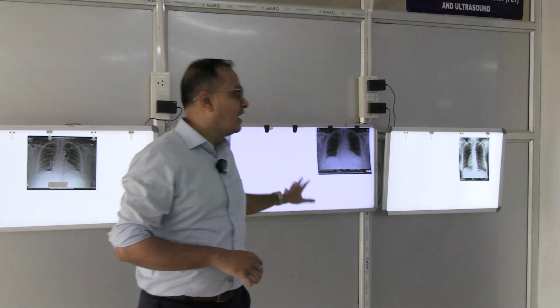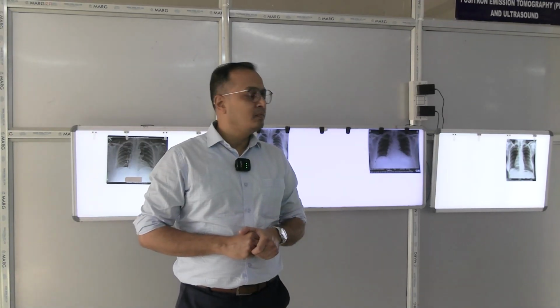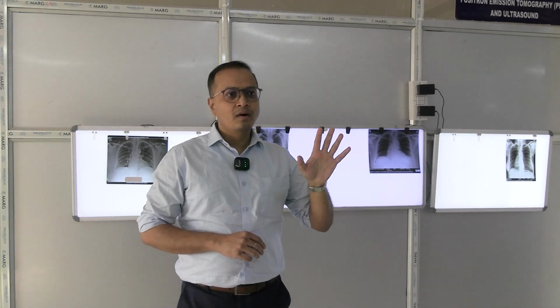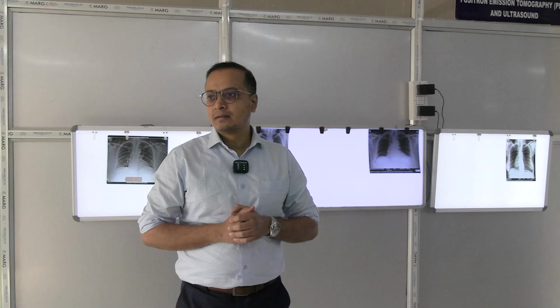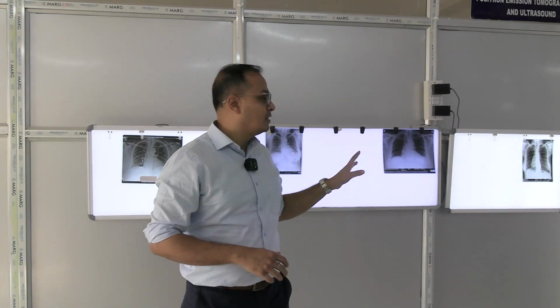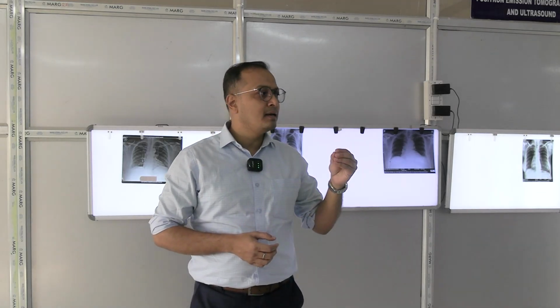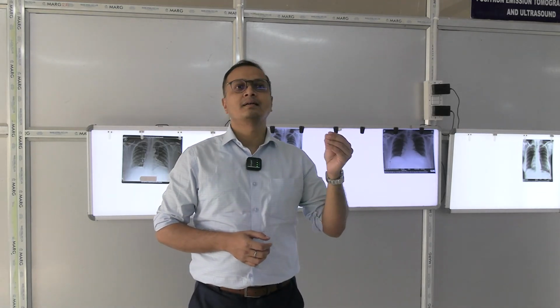So, we are going to cover radiology, the X-ray of the thoracic region. Whenever you are given these X-ray plates to tell the story of the X-ray plate, there are basic principles that you have to follow, whether this X-ray plate is a normal X-ray plate or it has any special character or not.